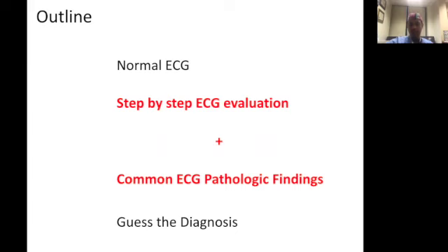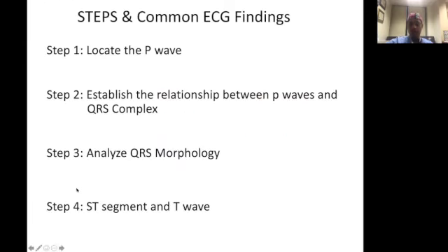findings. And really my goal is not that you will be experts on knowing what the diagnoses are, but being able to identify what is abnormal about that EKG tracing compared to what we've covered as normal. Okay, so even though we're going to look at some pathology, really my focus is going to be for you to tell me, okay, when I look at this EKG, I see this feature that is abnormal compared to what we have covered.